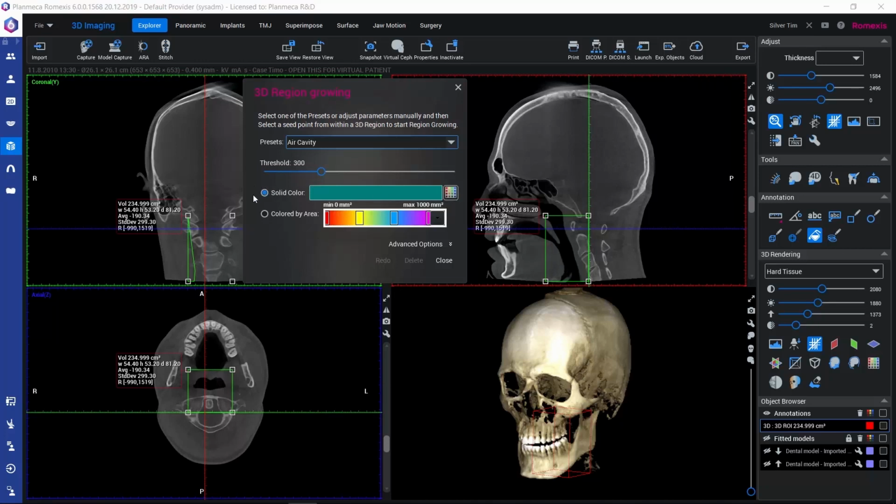With these controls, we can determine what color our segmentation will have. Naturally, we can also change that later. So let's now try with these values that are preset. Like said, we'll select a seed point here in the middle of the anatomy that we're interested in segmenting, and let's start the segmentation process with that.